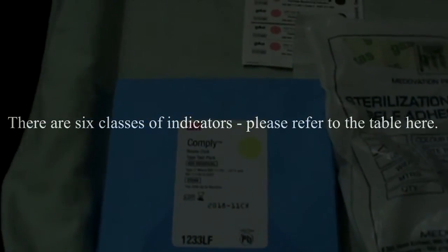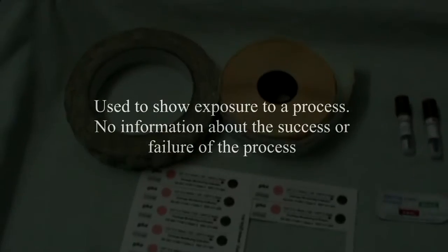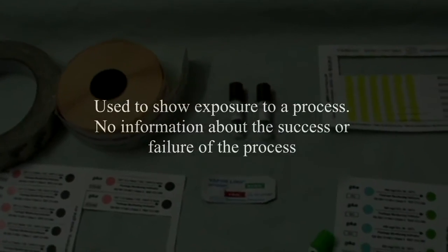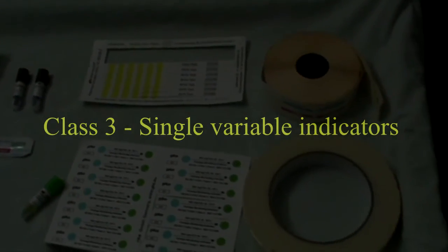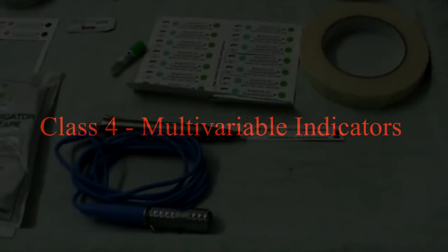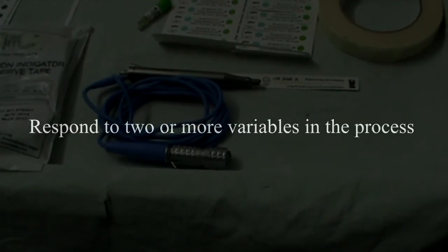There are 6 classes of indicators. Please refer to the table here. Class 1. Process indicators. Used to show exposure to a process. No information about the success or failure of the process. Class 2. Specific test indicators, for example BDT. Class 3. Single variable indicators. Respond to a single variable in the process, for example, temperature. Class 4. Multivariable indicators. Respond to 2 or more variables in the process.